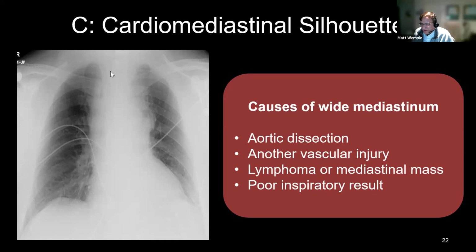Usually if you see the trachea, then you see just a very thin line, then you see the lung. And here you see a bunch of white basically, and I think this is where the trachea is in this film. And so this is why we get chest x-rays for people with chest pain, because we want to see if they have a widened mediastinum, because then we might start thinking about aortic dissection. This is one of the reasons we get a chest x-ray, I should say.